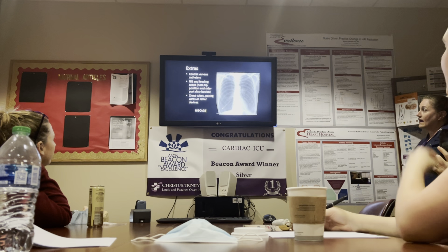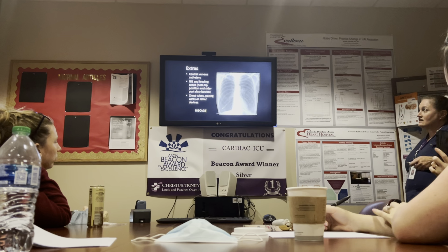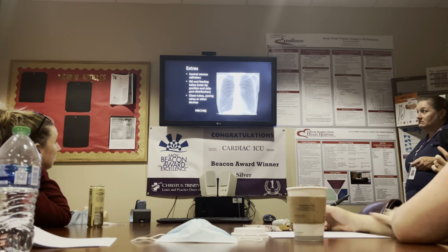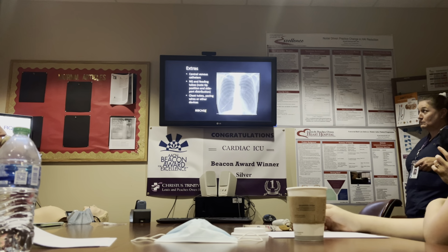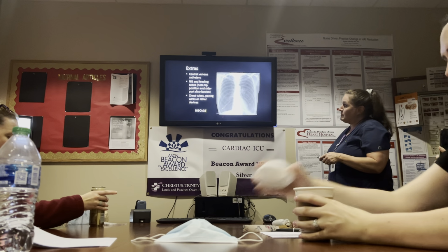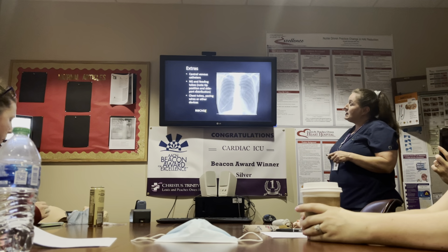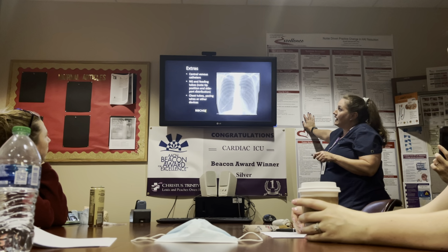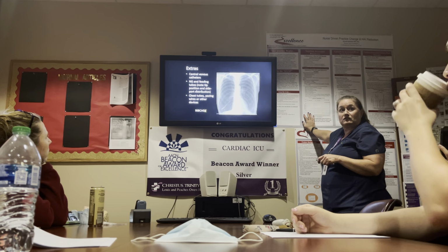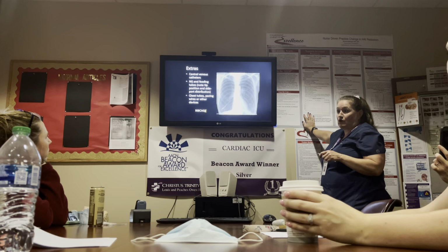And the hope is that with that, you don't end up having injected anything in there. Injecting air is okay, injecting saline is okay, but injecting tube feeds in there, that'll give them pneumonia. Exactly. And remember I talked about flattened diaphragms. Here's a good example of some flattened diaphragms. This patient is in extremis. When they have severe emphysema, they won't necessarily have a cough, and so that's probably what happened, this tube went awry because they weren't coughing.